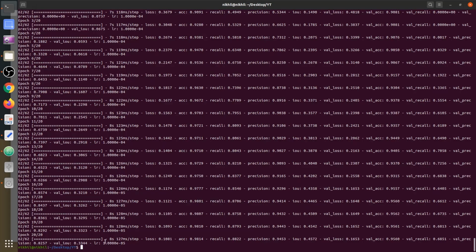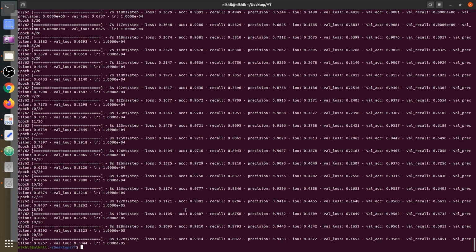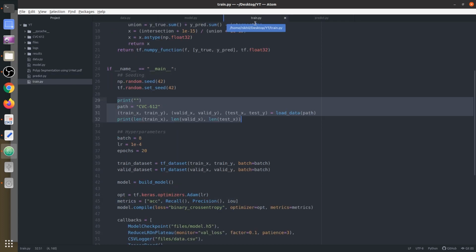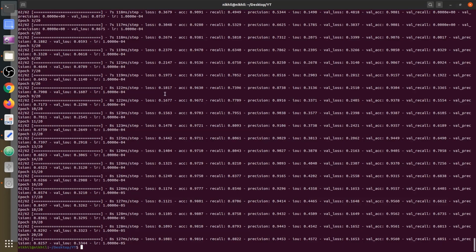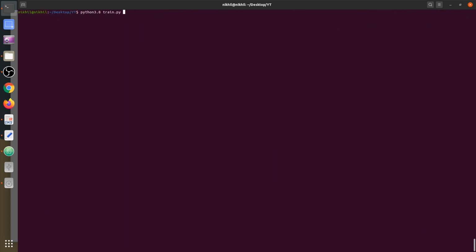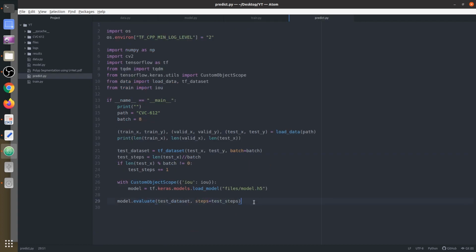And okay, training is complete. So these 20 epochs are finished really well on time. So what you can do till then, you can increase the epochs again to, let's do 50 this time, and start running again and see if there is any change, and till then we write the complete code.